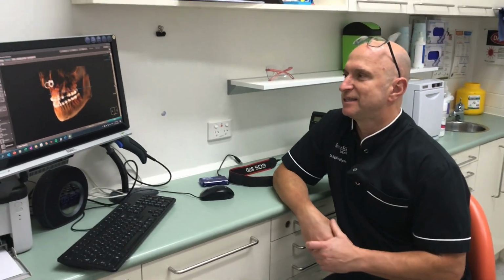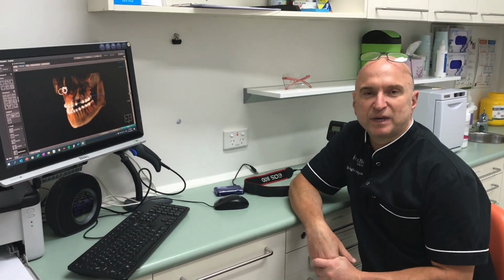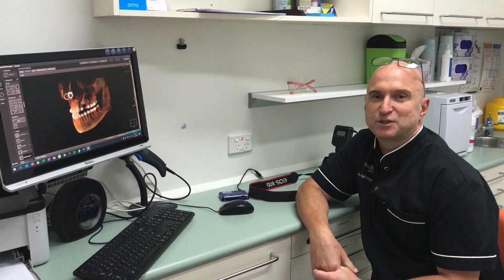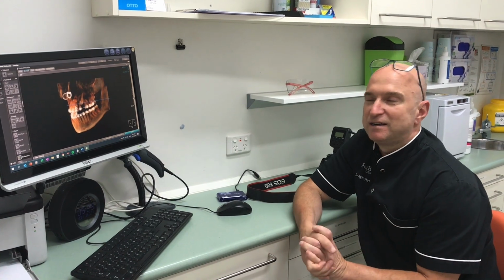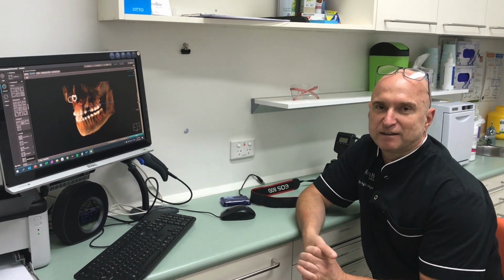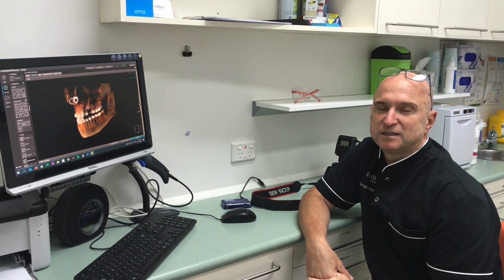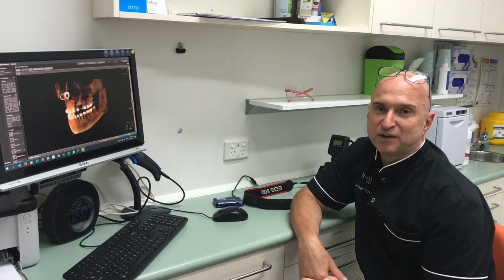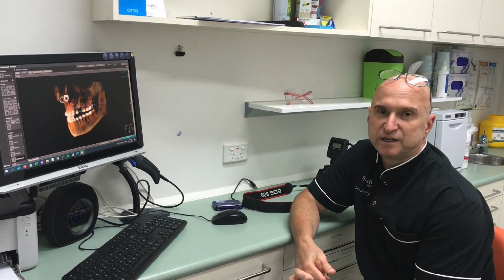Well, in the good old days we had the SLOB rule, same lingual opposite buccal, and that's how we used to work out where the canines are. Whereas since 3D has come into dentistry, and I've had it for quite a while, to me it's just a normal part of orthodontics for impacted canines. I do my own surgery.